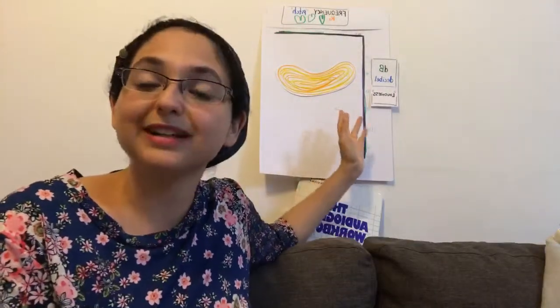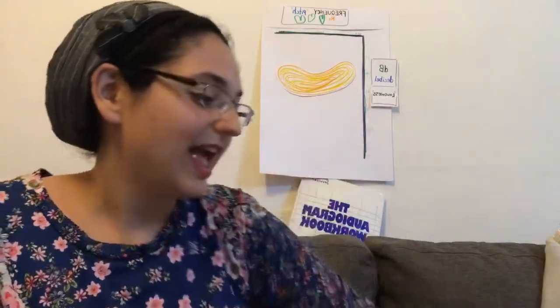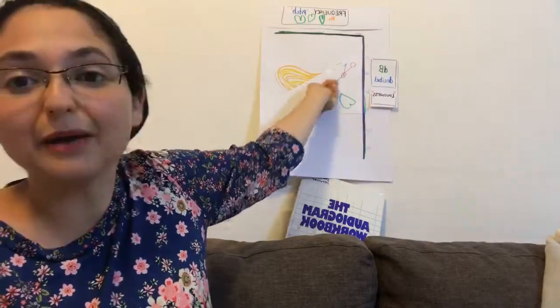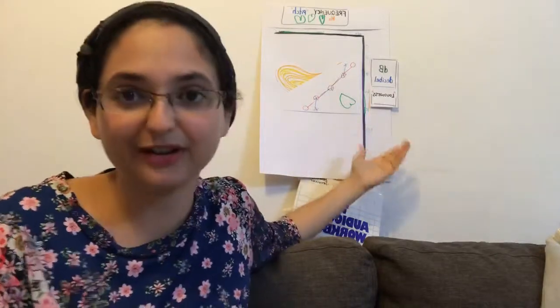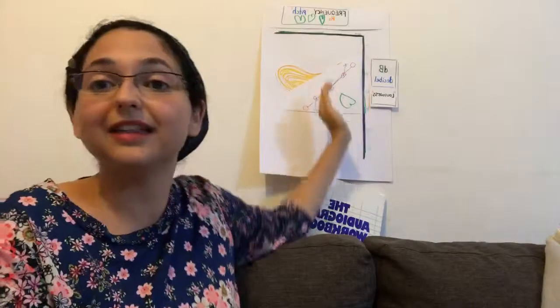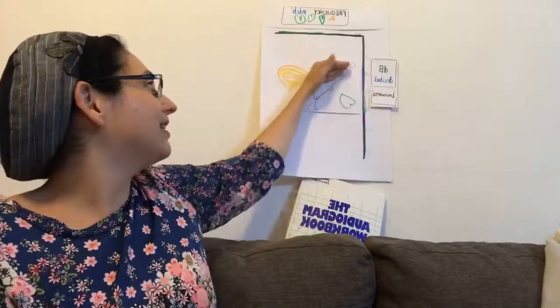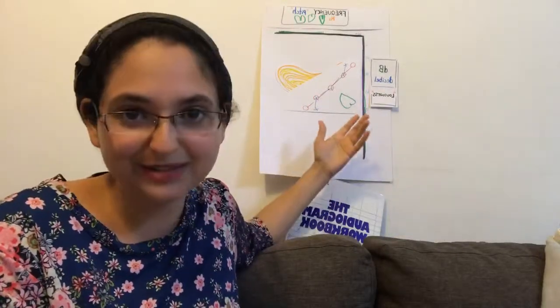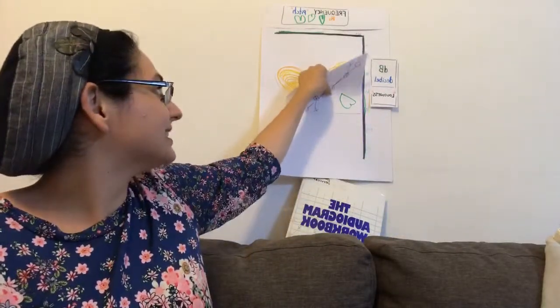And why this is important is because then you can take the speech banana and overlay whatever the hearing loss is, and see how much of the sounds of speech a child, or someone with this hearing loss, can hear. So any sounds that are above the speech banana, they could hear just fine, but any of their hearing loss that's coming in under the banana is where they're missing those sounds. So that's why the speech banana is a helpful little tool to understand what the hearing loss means. What are the sounds that somebody is hearing versus missing?